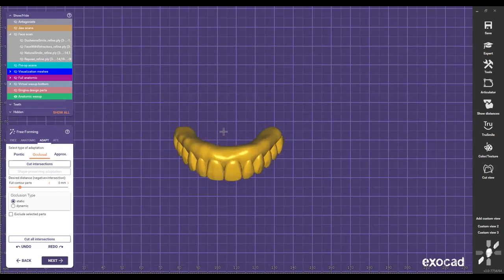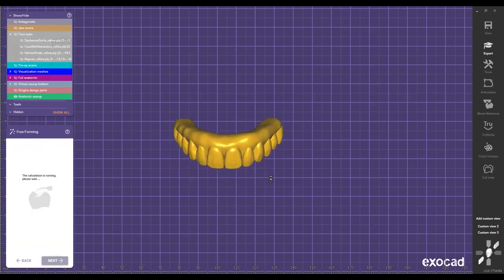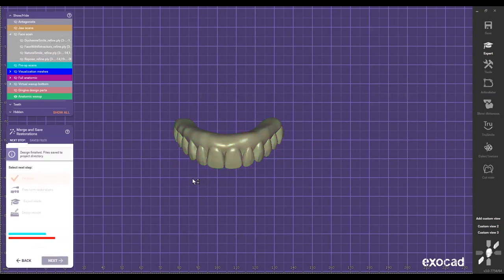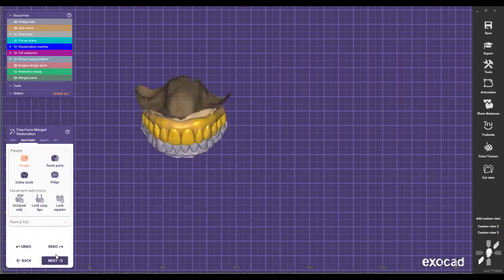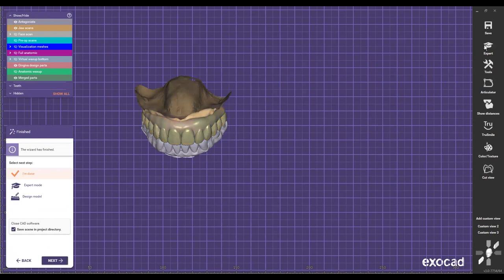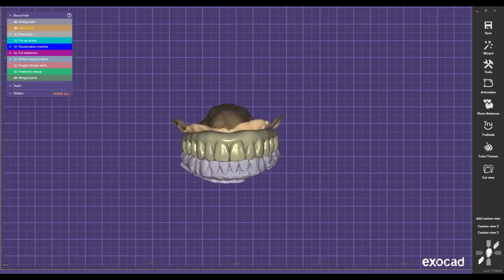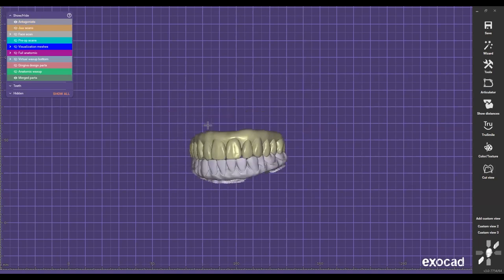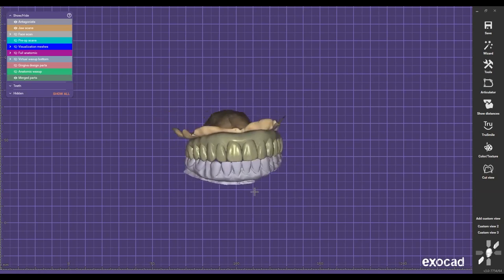Plus, we're able to get a bite, and that's how we deliver it. We nail the occlusion every time, especially for these complicated cases, when the patient comes with crooked teeth, bad teeth, right? So now we have everything. Now we can just go next. I check the occlusion, I check the aesthetics, everything looks nice. And then from here, I jump away, and now I'm pretty much done. This is going to be adapted to my implants later, and have everything ready to go.